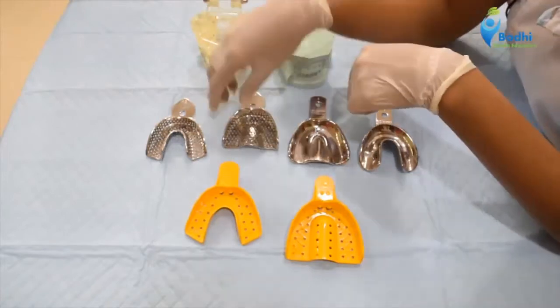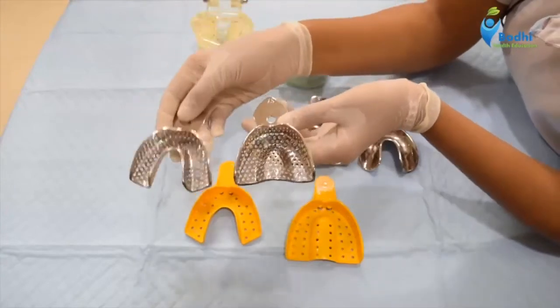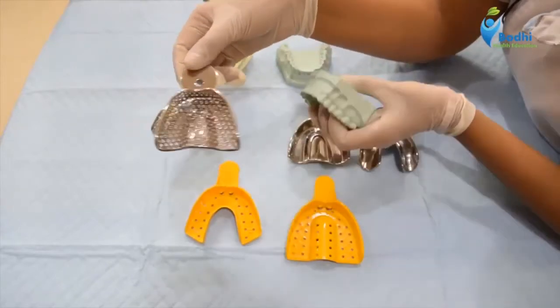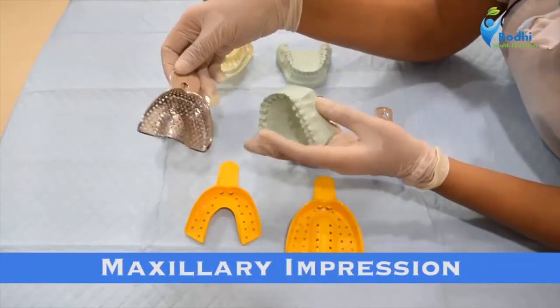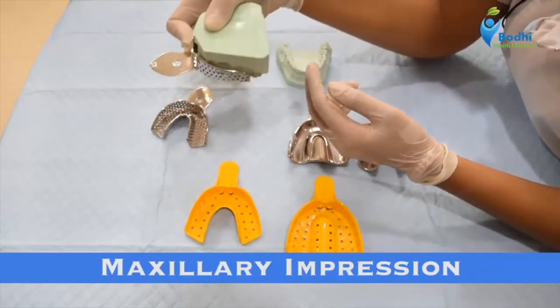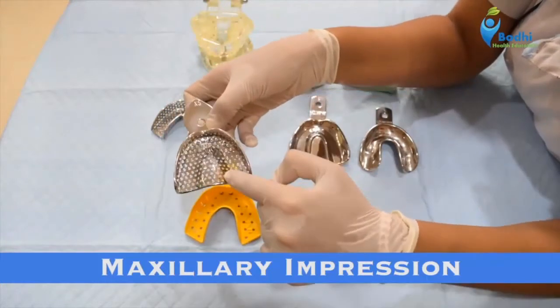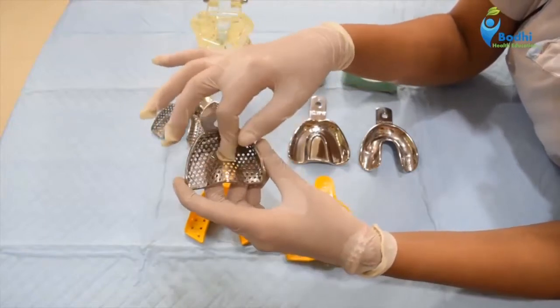Now as you can see, impression trays for the upper teeth and the lower teeth are different. So let us see what is the difference between the upper or the maxillary impression tray and the lower or the mandibular impression tray. This is a maxillary model. So to make the impression of the upper or the maxillary teeth, we use the maxillary impression tray. The maxillary impression tray has got a palatal vault. This vault area is used to record the palate which is present in the maxilla.